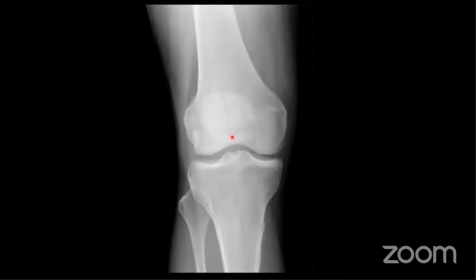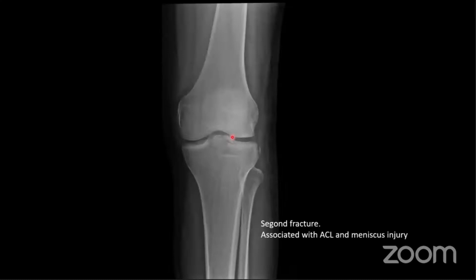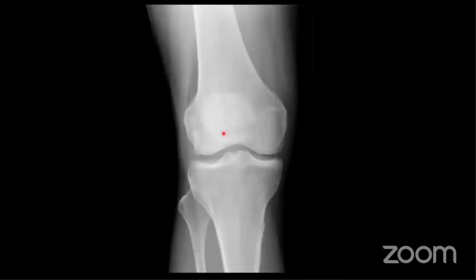Right, okay, I think I've got a couple more examples of knees. To recap, the principle to illustrate here is you see one abnormality, you don't stop looking. You finish your systematic review of the rest of the bones to make sure you don't miss anything else. Right, a slightly more simple one. What do you guys think about this?